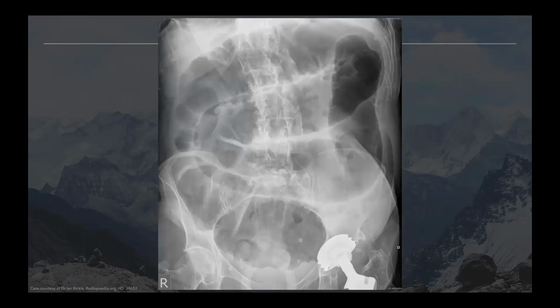So in contrast with this one, I would say something like, this is an abdominal radiograph. There are several dilated loops of bowel visible with haustral markings, which are these, spanning part of the width of the bowel lumen. This is suggestive of large bowel obstruction. There is no evidence of perforation. The lumbar spine is degenerate, and there is a left-sided hip replacement and a vaginal pessary. In summary, this is an abdominal radiograph demonstrating large bowel obstruction. The most common causes are malignancy, diverticular stricture, sigmoid volvulus. I would like to manage this patient by XYZ.